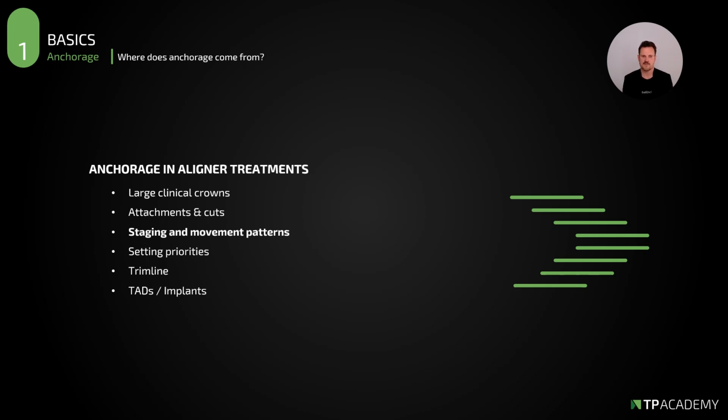And we also have the ClearCorrect software. The interesting part is that I can also see the staging in the software differently. I need to find out when I have the right staging. So what I need to say is, at the end, it doesn't matter which type of software I use. I need the right staging pattern for Anchorage, and that's it.